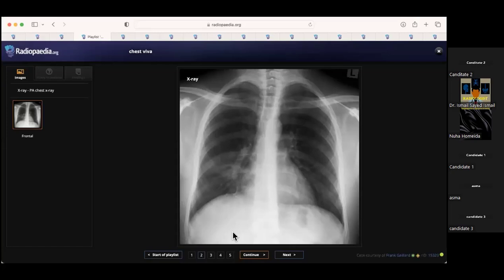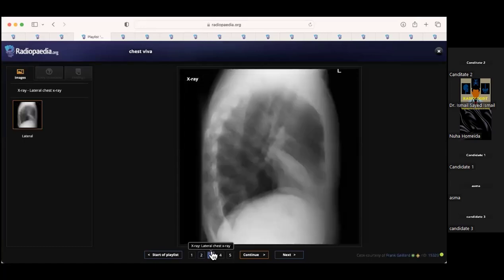And you just need to mention to the examiner and show them that you have the knowledge, and say, I can't see any vertical posterior ribs or a sharp upslope or a 7 configuration of the anterior ribs. The confirmatory test is a lateral chest X-ray. We don't do it quite a lot here in the UK, perhaps not in Birmingham, but it is done just to confirm that it's a simple collapse. Okay. Thank you.